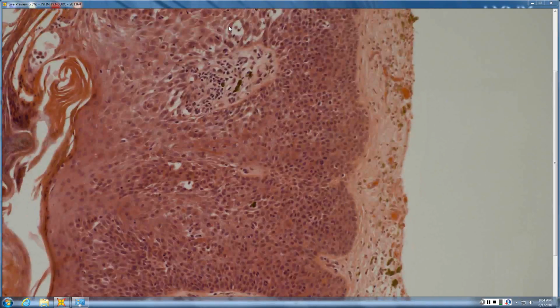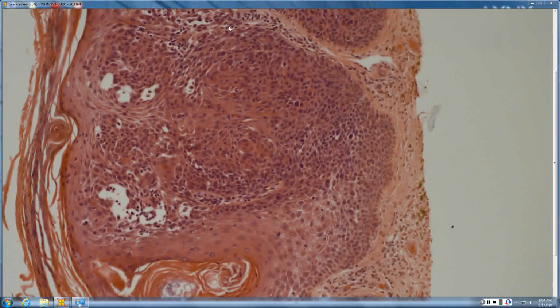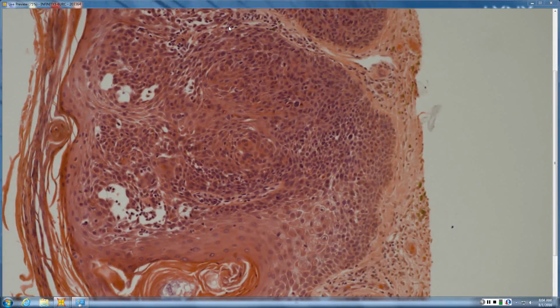Okay. So what are you thinking? Squamous eddies and spindling, more likely clonal seb or more likely Bowen's? Probably more likely Bowen's, I think. So even though it was the first choice, clonal seb. Okay. So a lot of things we're looking at are things that get miscalled, and so are important in the differential. So, intraepidermal clonal squamous proliferation.